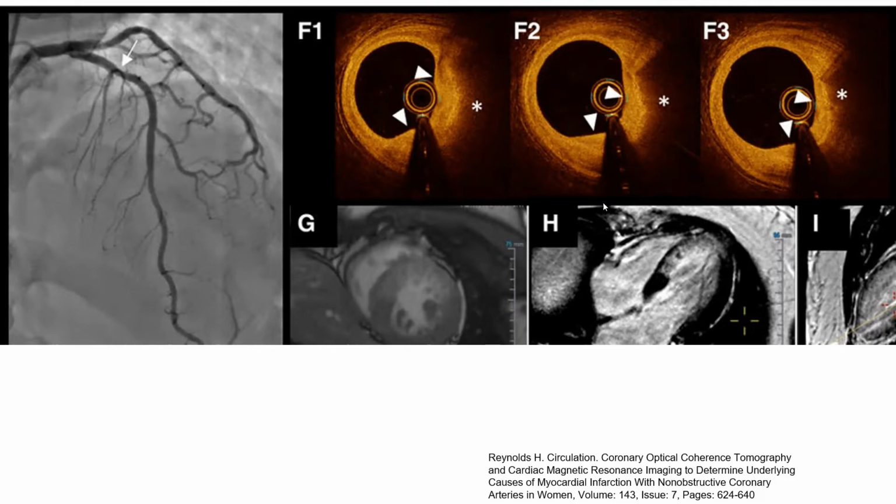So there is no plaque rupture, no plaque erosion. But there is this interesting phenomenon that Reynolds and colleagues describe very well. So you see here a fibrous intima that all of a sudden has a sharp bend, and beyond that sharp bend, it starts to look different. You see lipid core covered by some fibrous or some heterogeneous type of intima.